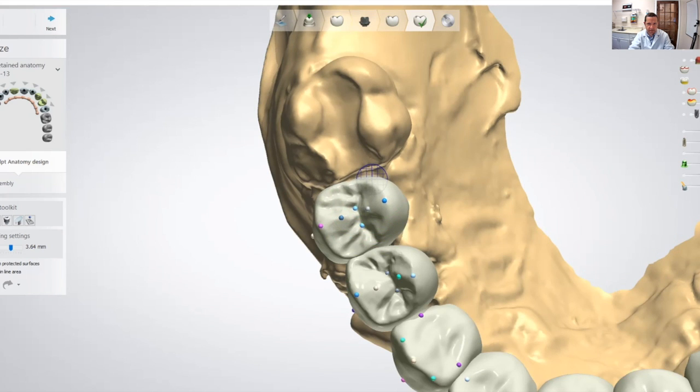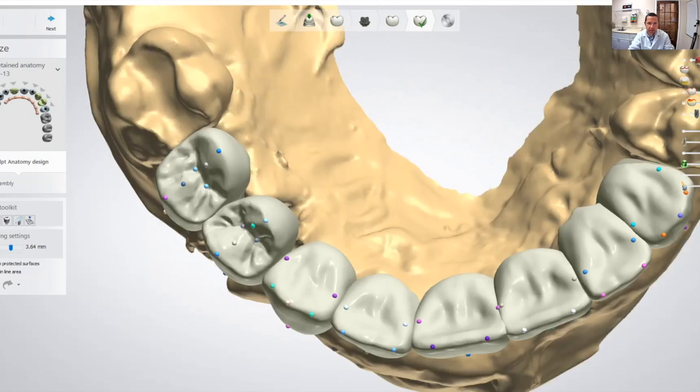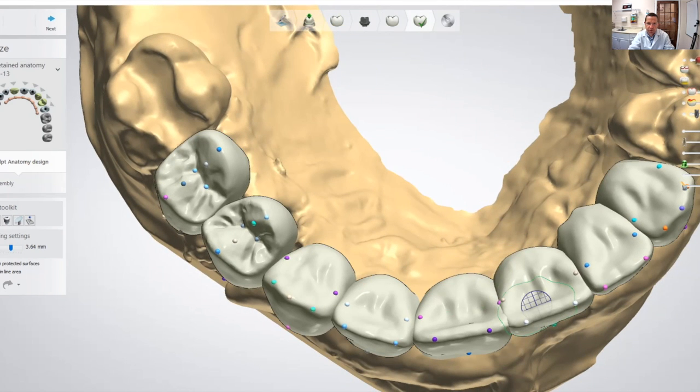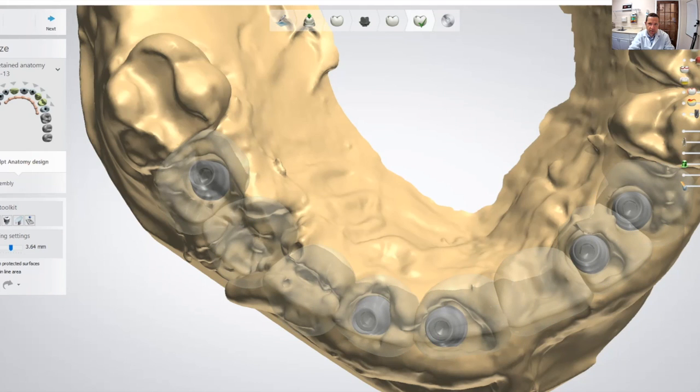Seems like the contact is very light. I'm going to reinforce there. I'm going to look now for very thin spots, so I'm going to reduce the size, the transparency, the bridge.